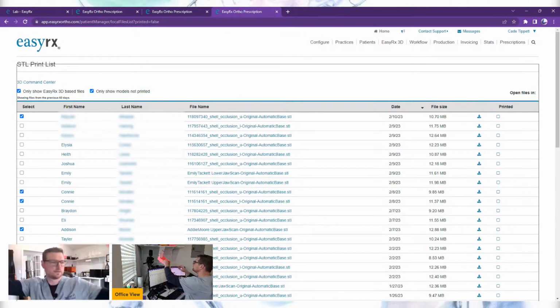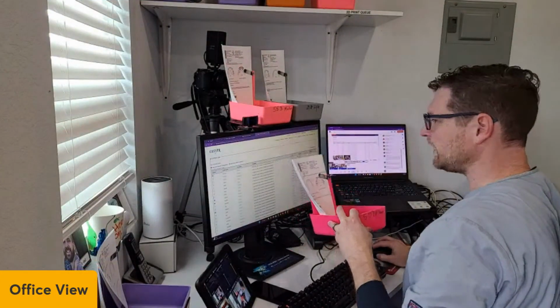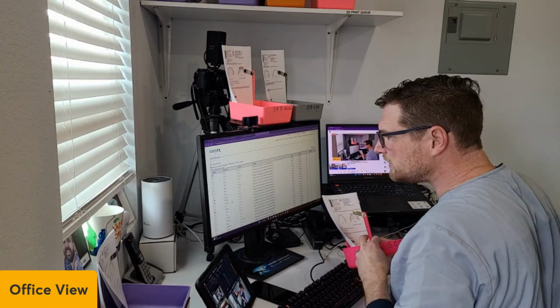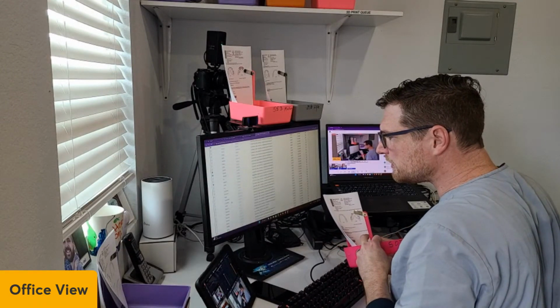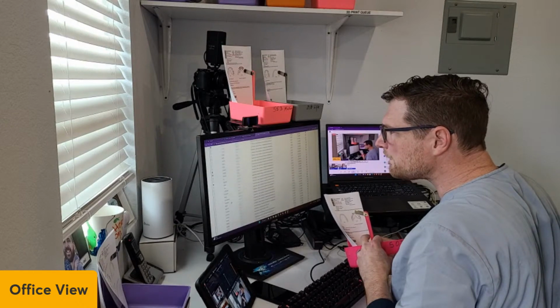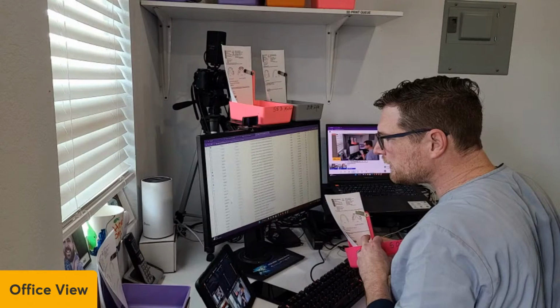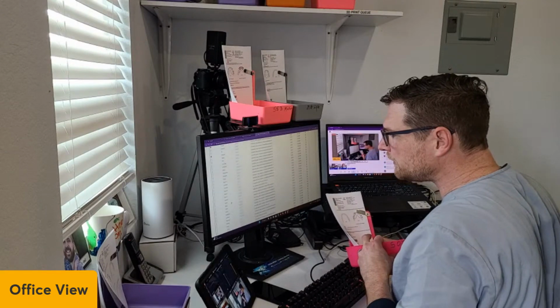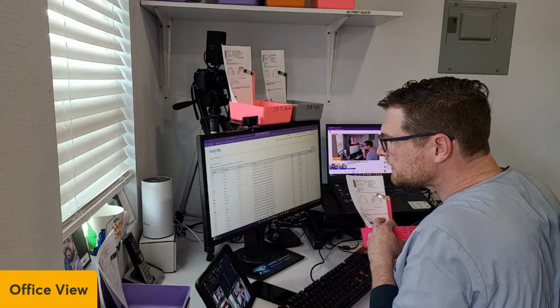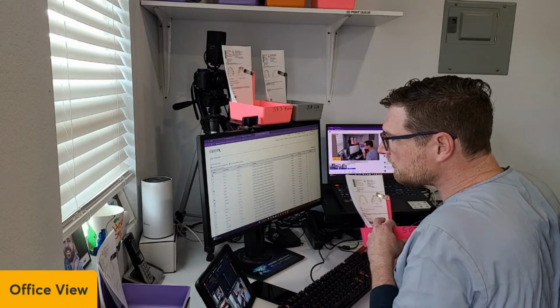I'm going to set that to the side up here, and grab my next one. I'm trying to not say these names out loud. Usually they're in here close together. I don't see it. Come on, where are you at? Nope, nope, nope. Usually this goes pretty fast. Okay, let's try that one. Here we go. So I have 1, 2, 3, 4, 5. All right.